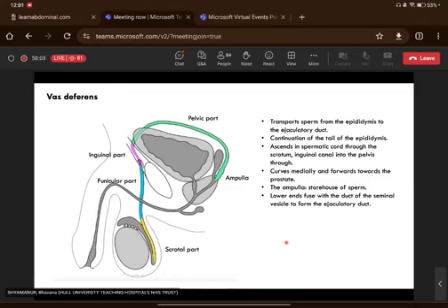How can you tell the difference between a male and a female pelvis on an axial CT? I agree, it can be tricky. Of course, a sagittal makes it much more straightforward, so does a coronal, but sometimes if you do have an isolated axial slice just through the lower pelvis, it can be hard.